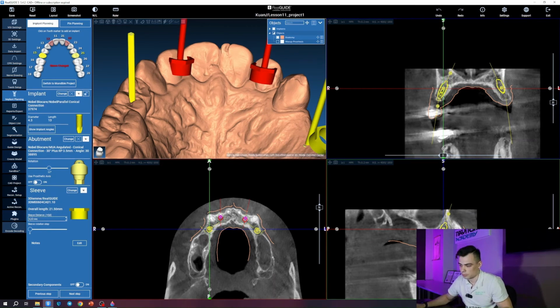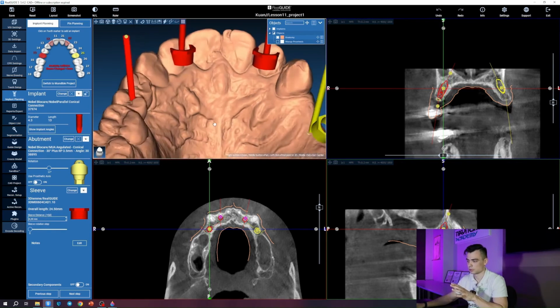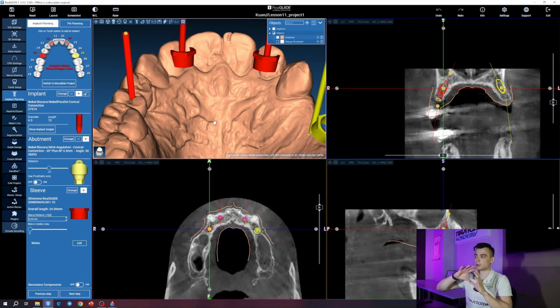That's it. Turning the implant further isn't really an issue, especially if you're using straight multi-units, because in that case the rotation of the implant's internal hex isn't as important. But if these are angled implants like the ones I just worked with, then it becomes extremely important because the implant's internal hex will determine the orientation of the multi-units and the position of the multi-units screw channel.